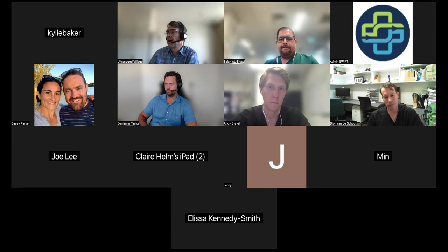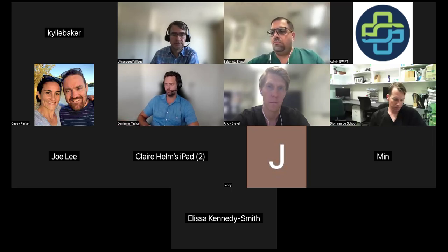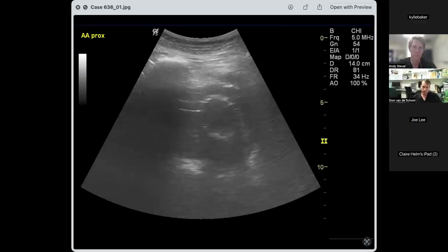Okay. Let's just share my screen again and we'll go through and have a look at this. Who did we get down to? Andy, I think you're next on my list. Not surprising, that just shows there is a stent. We'll move on from that.